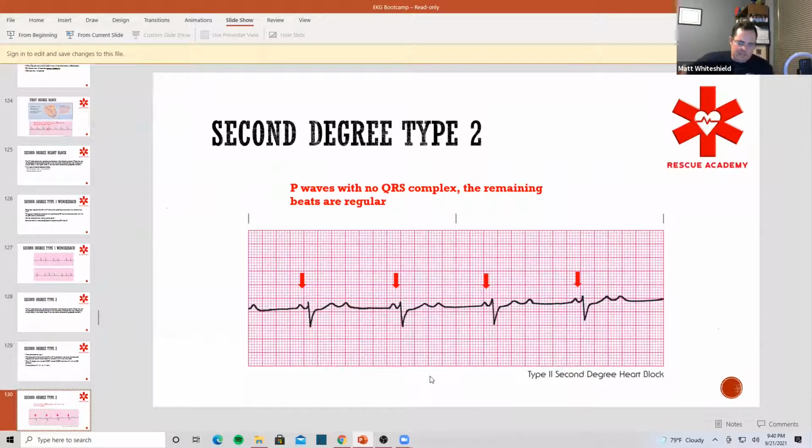Now, I knew, Zach, someone was going to ask, and honestly, I would have no idea. Because remember, all a U wave is, is just an additional beat after a T wave. So that's kind of what we have, an additional beat after our T wave. So this can easily be mistaken. And it's funny because whenever you look up hypokalemia and how you can differentiate it, it even says it in the textbook: often misdiagnosed as a P wave. And if it is consistent, this can easily be misconstrued as, hey dude, these are U waves.